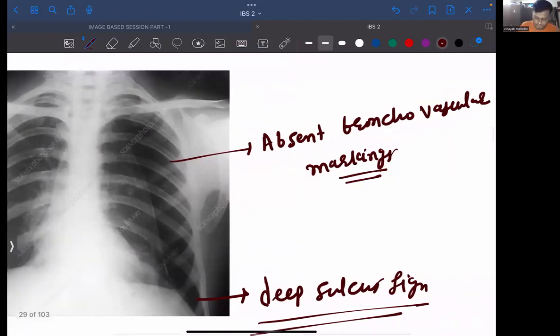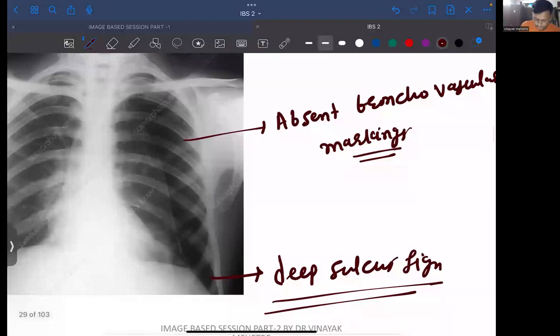Again, viscera and pleura. Visceral pleural reflection. ये जो लाइन दिख रही है, स्ट्रेट लाइन आ रही है बिटवीन विसरा, दैट इज ऑर्गन्स, और प्लूरल कैविटी. ये लाइन क्या कर रही है? दोनों को डिफाइन कर रही है क्लियरली.